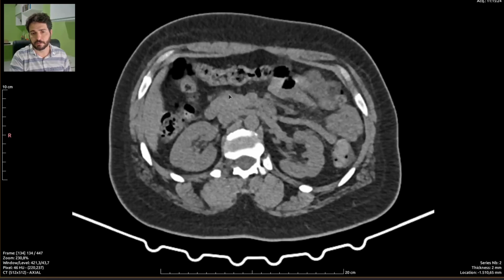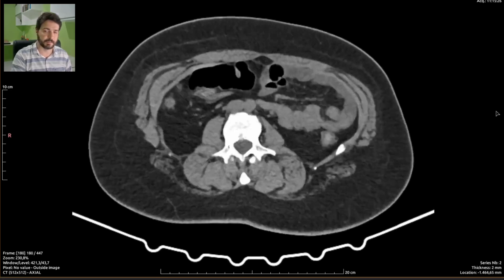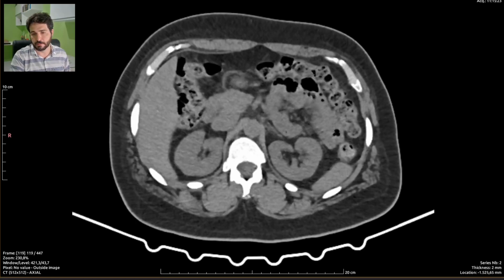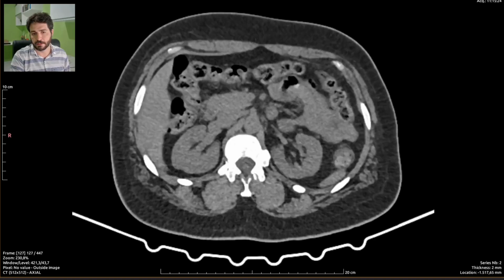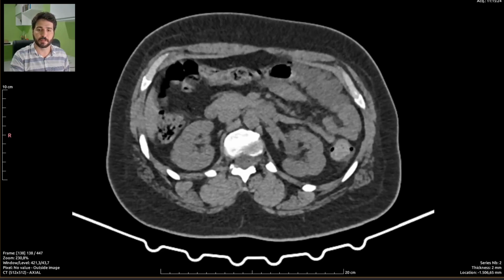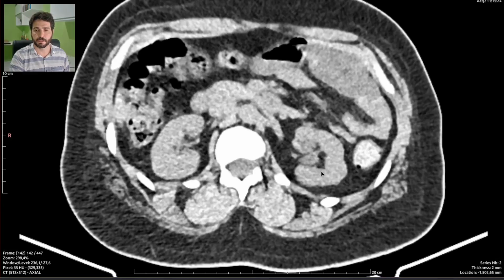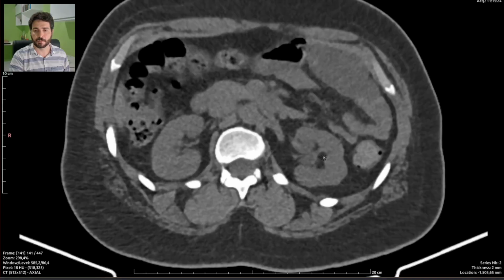I can't really tell. The kidneys are right here. I know you guys were anxious for me to speak of the kidneys, since the reason to do the CT scan was the suspected kidney stones, but there isn't any stone. There are tiny hypoattenuating lesions on the kidney sinus on the left.